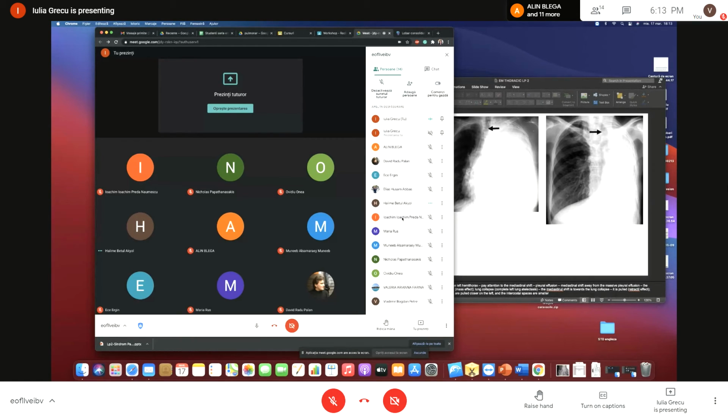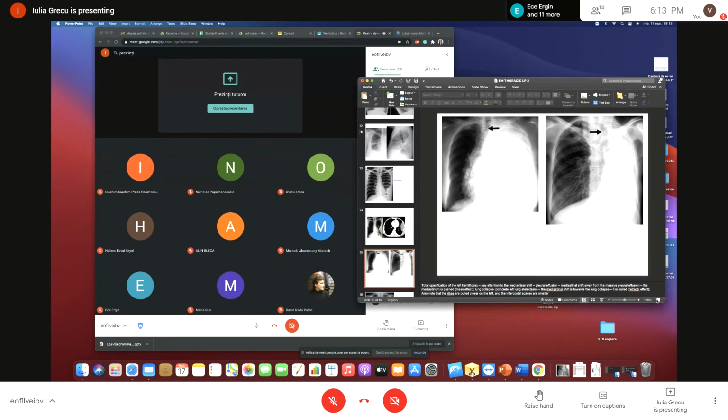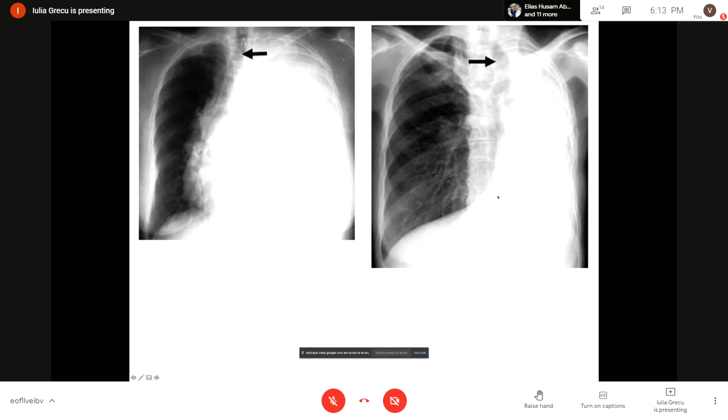So, Joachim. Thank you, Halime. Yes. Thank you. Okay. Just a second. Here. What do you think is different? The most important difference between the two images? Oh, sorry, my mic wasn't on.